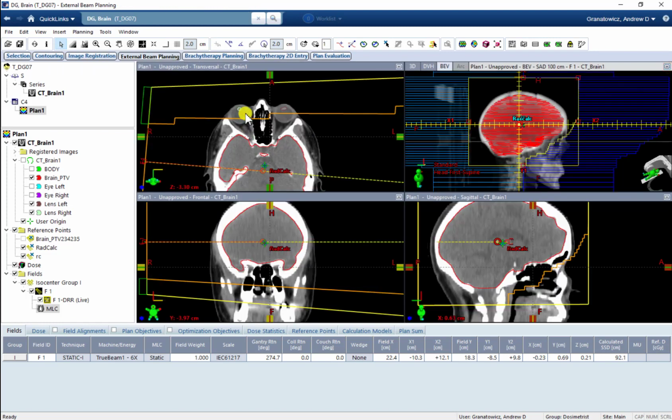So then if we go look here, it just depends where you hit your MLCs. Obviously the MLCs are not a perfectly straight line, right? But in general, you want that perfectly flat beam surface right behind those lenses, okay?